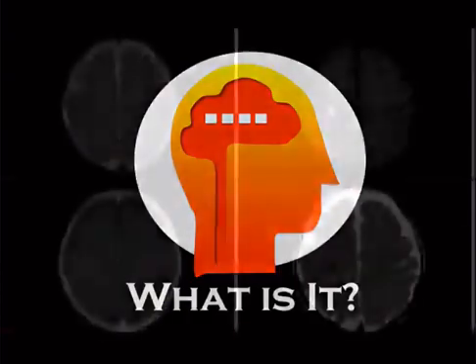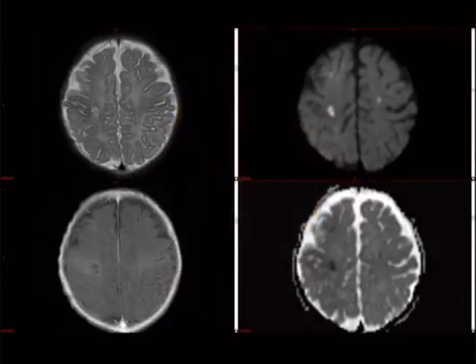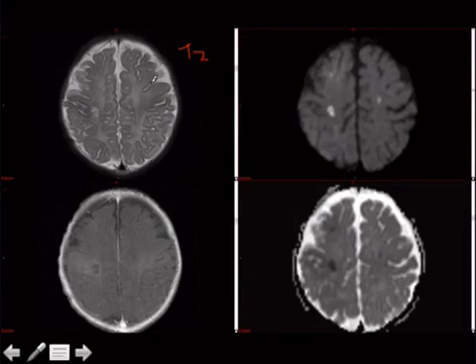Okay, so next case, I'm going to tell you this is a 6-month-old. And that's important. Let's review this real fast. This is a T2, right? But because I said that because the CSF is bright. But it's weird, right? Because the white matter is white. White matter is supposed to be white on T1, not T2. But this is a kid.